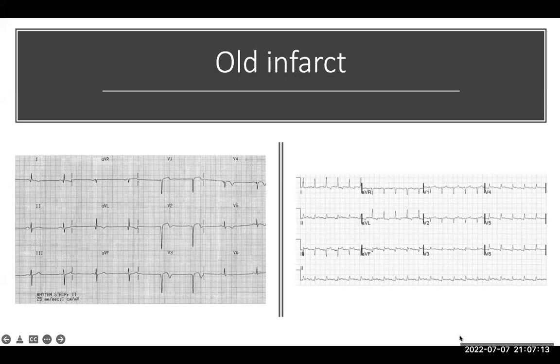Because normally, the way the stimulation of the heart occurs, you expect a small R. So instead of R, if after the Q wave it is coming down, then that is like in this case. Usually there's a small notch here where my arrow is. But if you don't see that and it's coming down straight the way it is here, then that's what you call a Q wave. Now, some leads can have a small Q wave, especially the lateral leads, like lead 1, AVL, V5, V6.